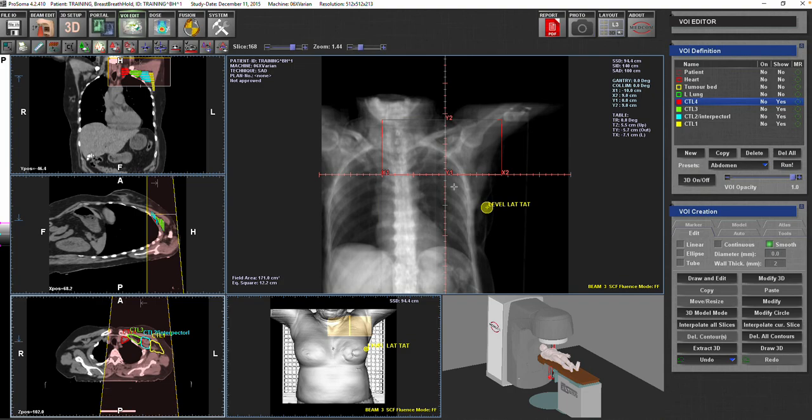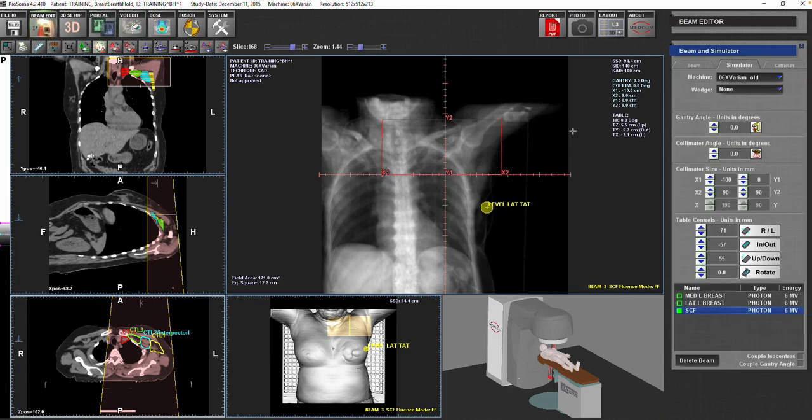So we all know that for the anatomical landmarks for the supraclav field, we use the medial border to be at the lateral border of the vertebral body. In other words, it will be the medial border of the internal jugular vein. So because we used to put our medial border on the lateral edge, this is X1. So X1 will be, now we close it, to put it at the lateral edge of the vertebral body, because we are doing this in a kind of routine.